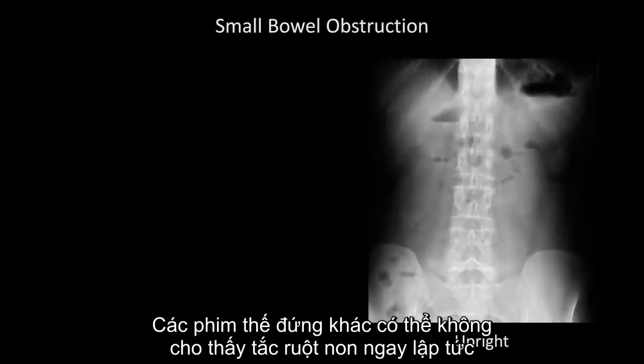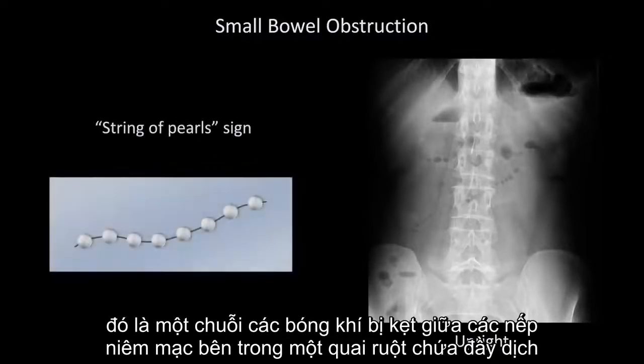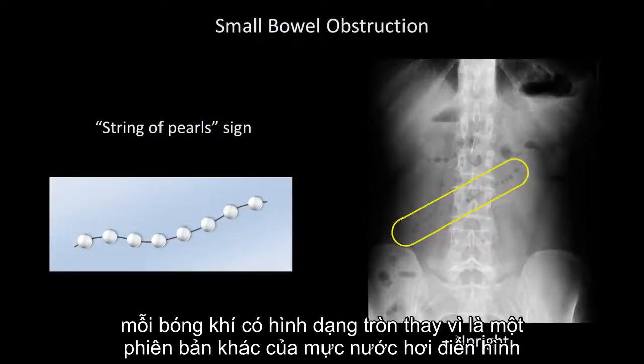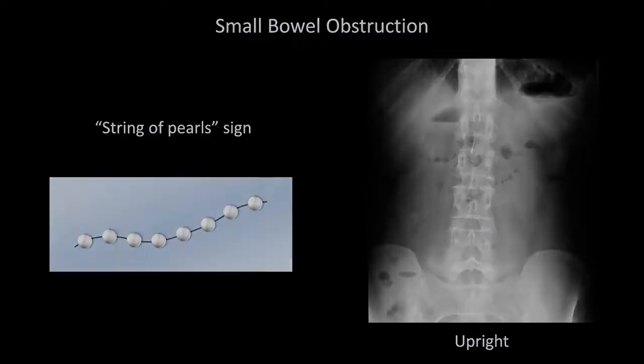This other upright film may not be as immediately obvious an example of an SBO, but it is a good example of something called the string of pearls sign, in which a chain of small air bubbles are caught between mucosal folds within an otherwise fluid-filled bowel loop. Each one looks round instead of having miniature versions of classic air fluid levels due to the effect of water's surface tension at that smaller scale.